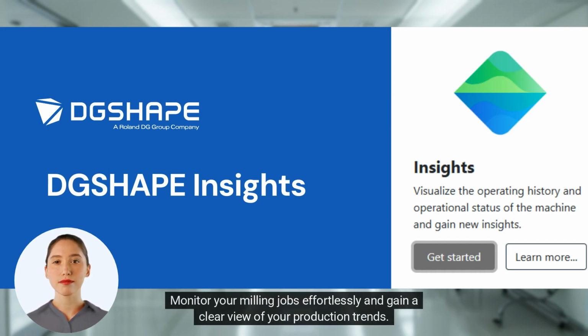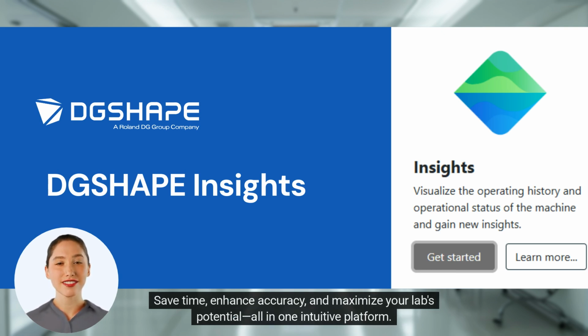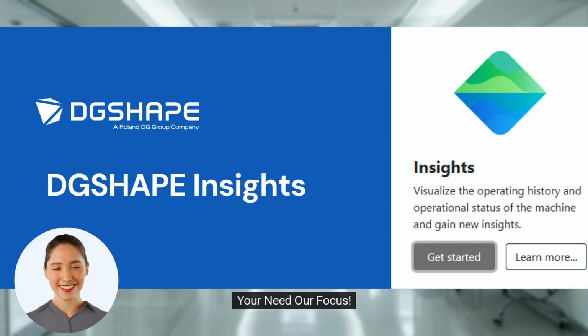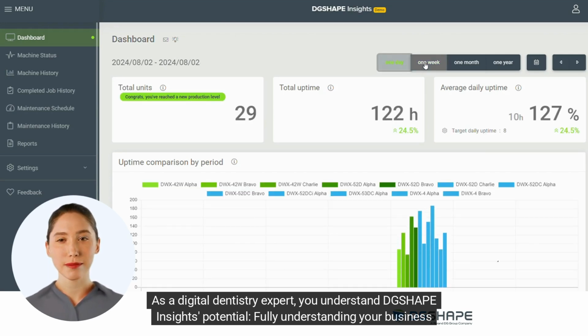Monitor your milling jobs effortlessly and gain a clear view of your production trends. With Insights, you can make smarter decisions to optimize efficiency and improve workflow. Save time, enhance accuracy, and maximize your lab's potential, all in one intuitive platform. Your need, our focus. As a digital dentistry expert, you understand DGSHAPE Insights' potential.